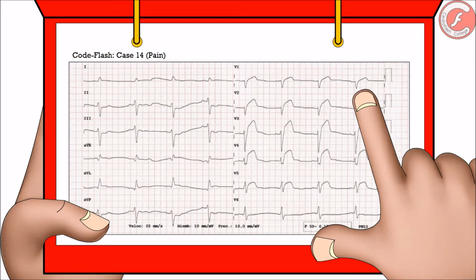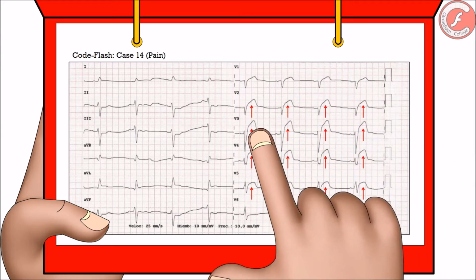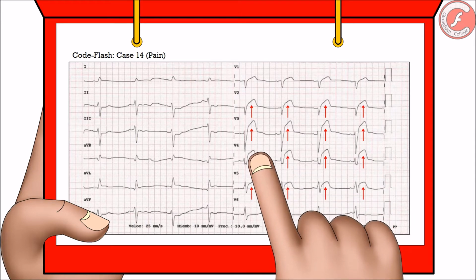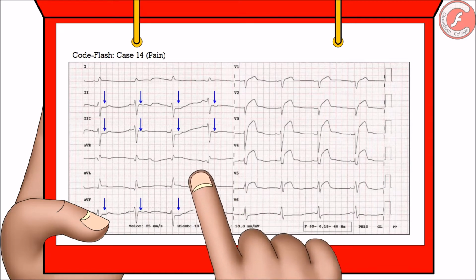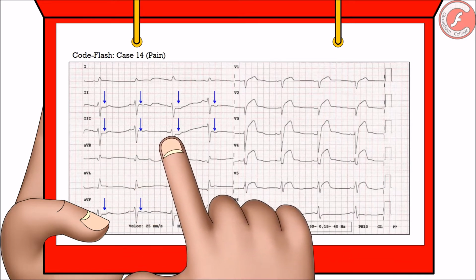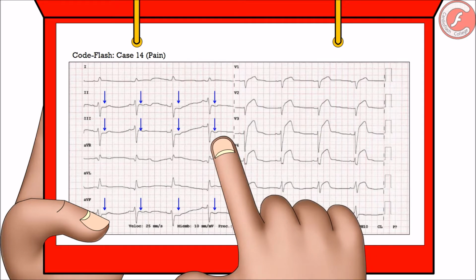Unfortunately, in this case we did not have a previous electrocardiogram to establish the comparison, but it was not necessary either, since there were electrical signs that suggested the existence of an anterior STEMI. These are the ST elevation of more than 5 mm in V3, V4, and V5, and the specular descent of the ST segment in inferior leads.